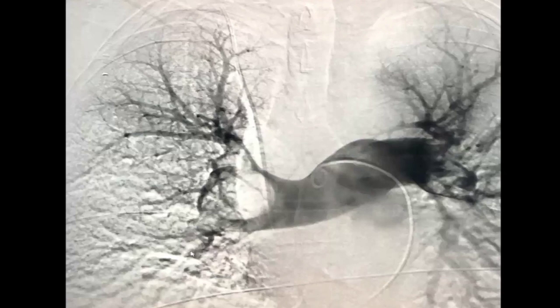So some are like saddle embolism or branch emboli, or based on the cause, is it a true thrombus, a blood clot, or is it a fat embolism? Okay. So what you see is a large pulmonary embolus that has occluded pretty much the right main pulmonary artery. This patient had a CTPA, which shows this finding.